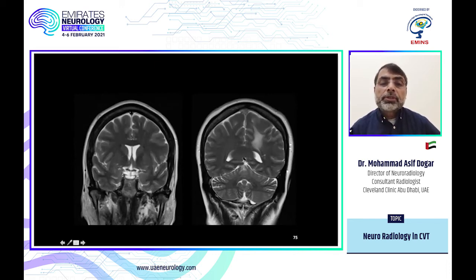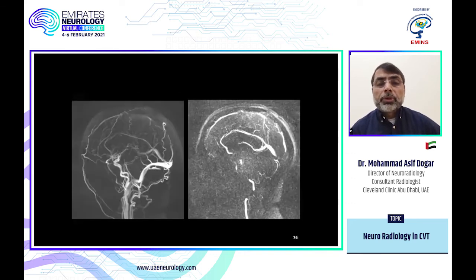in the sagittal sinus. Here it is dark on T2, which is normal signal. This one is not dark. So this is the thrombosis of the superior sagittal sinus presenting as bilateral parasagittal vasogenic edema. And here on the MRV, it is confirmed. The main thing is to diagnose before MRV, because if you suspect something on those images, then are you going to order the MRV or the CTV?